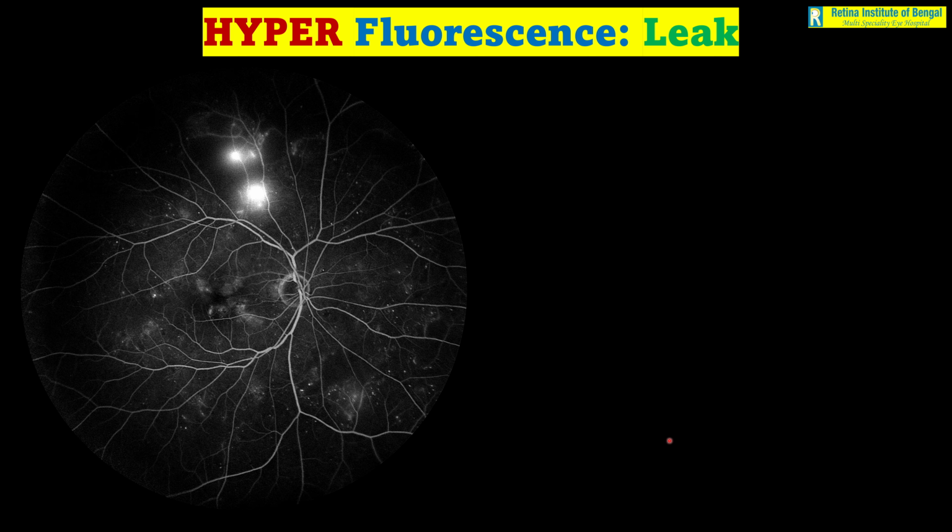This can happen when there is an abnormal retinal blood vessel. Abnormal retinal blood vessels or new blood vessels leak very easily. Their integrity is much weaker compared to a normal blood vessel. Their endothelium is leaky, and therefore when we do angiography, abnormal blood vessels, NVEs and NVDs, show up like this: intense white light bulb phenomena, as if some bulbs are glowing in the dark night. So this is one type of leak, and this is another type of leak.